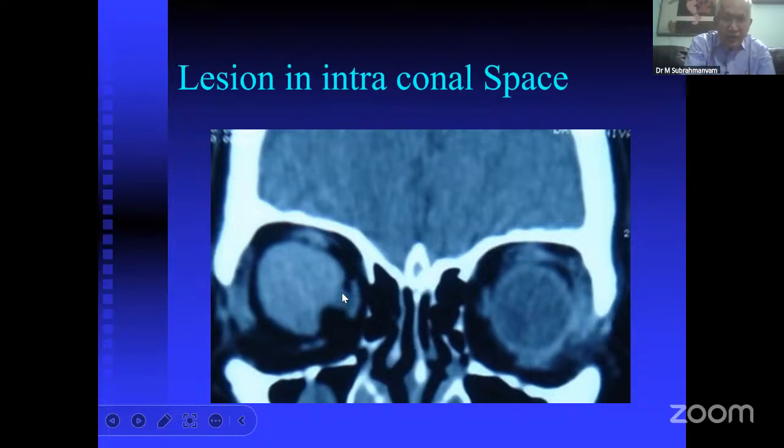So it's the intraconal mass lesion, and the most common intraconal mass lesion, with these typical presentations: number one, a long-standing lesion, usually a couple of years by the time the patient comes to us. Number two, uniformly isodense with the brain, margins are very clear-cut, and minimal contrast enhancement will usually be seen.